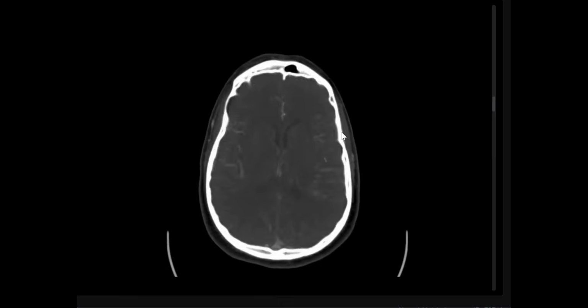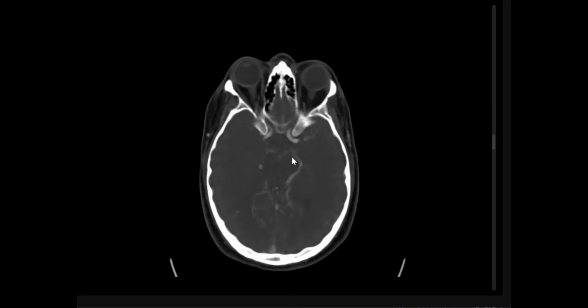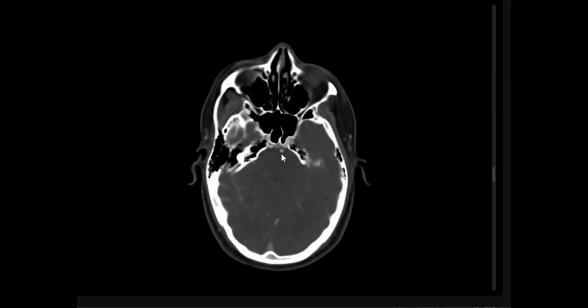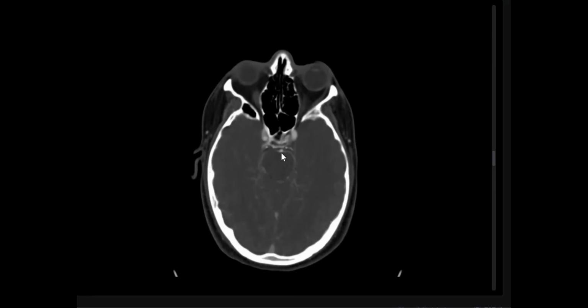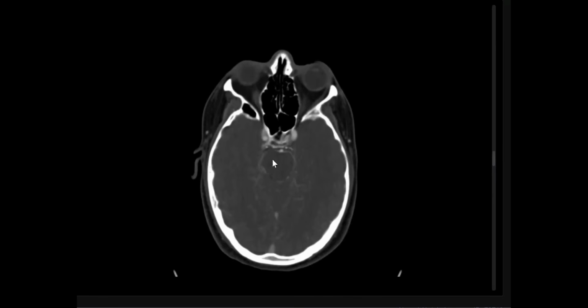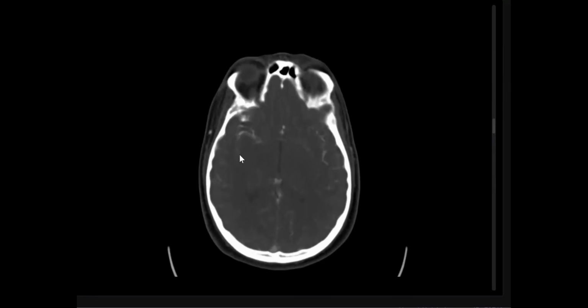Now, my friends, do you see any aneurysm? Because you are looking for an aneurysm. No aneurysm. Good. And sometimes you see small caliber of the basilar. Why? Vasospasm because of the bleed. Excellent. So if you see no aneurysms, what is your diagnosis and what is the next step? Perimesencephalic subarachnoid hemorrhage secondary to rupture of the small veins in this region.